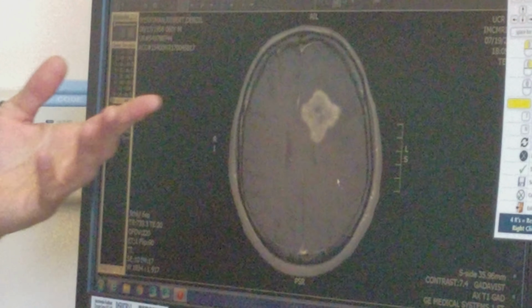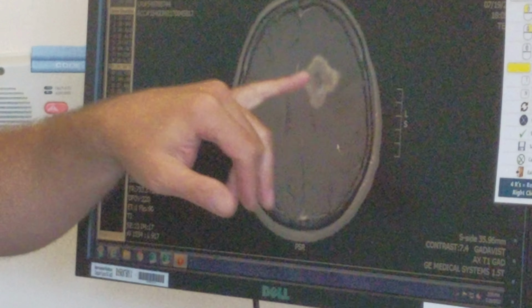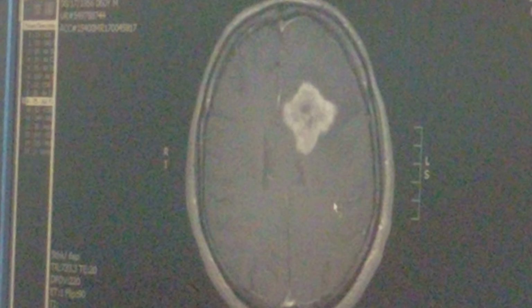In general, mostly because it already has a necrotic central region. What does necrotic mean? Necrotic, dead. So the middle of the glioblastoma is dead? Well, it looks that way. We're just playing with pictures here, but you can see kind of a central ring, and then you assume that this little darkened tissue is necrotic and has died off. That's what a glioblastoma does: it surrounds itself, and then everything in the middle dies off, and as it grows bigger, the middle dies off.